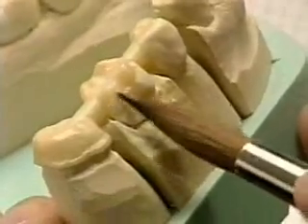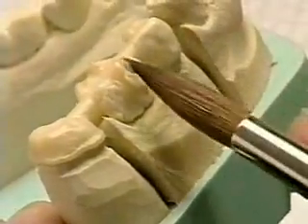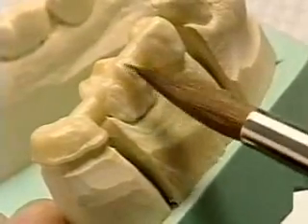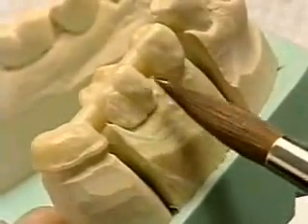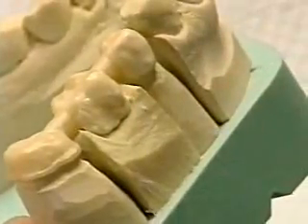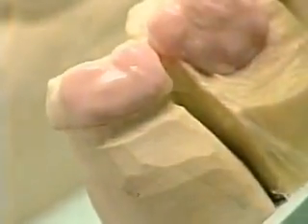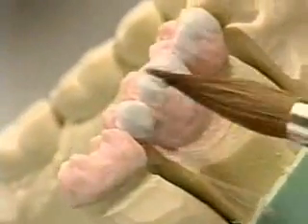Now the lava frame just has to be veneered. For that, lava ceram is available, a veneering ceramic tailor-made for the heat expansion of the lava zirconium oxide frame. The lava ceram assortment is orientated to the Vita Classic color system. Along with dentin and enamel mixtures, there are intensive and effect mixtures to enable natural characteristics to be recreated.